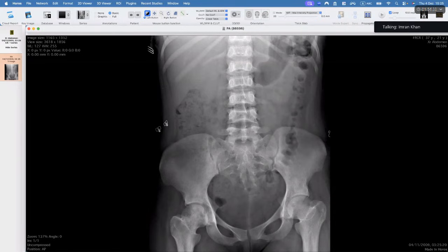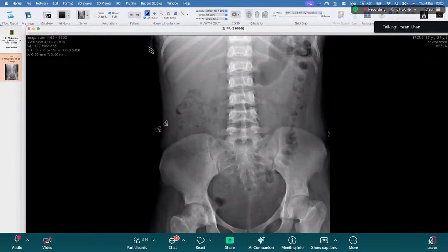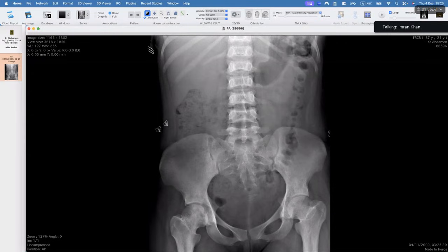Okay. Autosplenectomy is calcified spleen. Okay, so not splenomegaly. You're right, you're looking for autosplenectomy. So there's no calcified spleen. That's one pertinent negative differential. The other pertinent negative differential is no gallstones. Okay, so you can give these negative differentials, right?